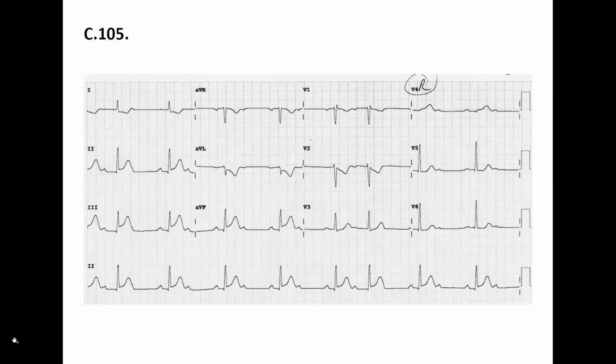So I started by looking at the rhythmicity and whether it originates from the sinus node. We can see that there are P waves before every QRS. They're also positive in lead 2 and negative in aVR, so we know that it's a sinus rhythm. It is around 60 beats per minute, about 5.5, sometimes 6 squares. But it is noteworthy that this is not the same all throughout, which I will talk about a little bit later. First, looking at the intervals, they are normal and there's a 1-to-1 conduction ratio.